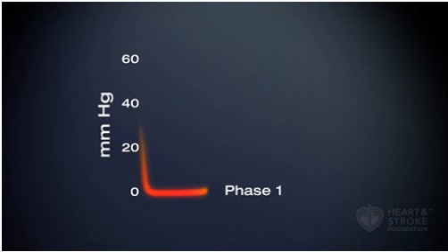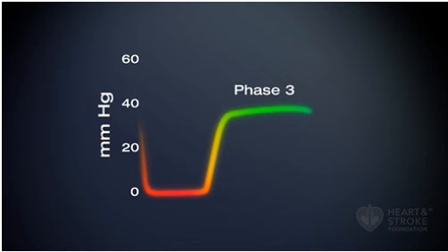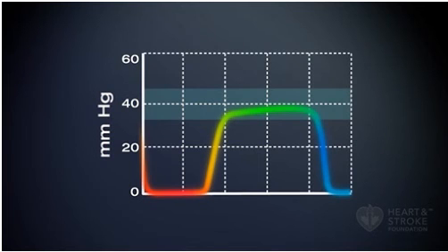When the patient first exhales, the initial portion of the breath consists of the air in the dead space from the breathing tube and the trachea. As air from the alveoli begins to empty into the circuit, carbon dioxide levels start to increase. This is shown as an upward deflection at the beginning of the exhaled carbon dioxide curve. As exhalation continues, carbon dioxide continues to pour out of the lungs until the next breath is initiated. The highest value in the curve is called the end-tidal CO2.